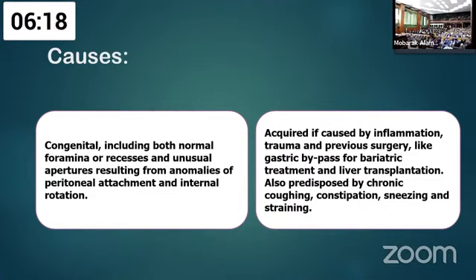Key points to diagnose internal hernia: a cluster of dilated small bowel in an abnormal anatomical position, signs of small bowel obstruction, convergence of vessels and mesenteric fat at the hernial orifice, displacement of mesenteric blood vessels, engorgement and twisting and stretching of mesenteric vessels. If strangulation occurs, CT signs of transmural ischemia include loss of wall contrast enhancement, pneumatosis intestinalis, portomesenteric venous gas, and pneumoperitoneum, and lastly, abnormal displacement of surrounding structures around the hernial orifice.